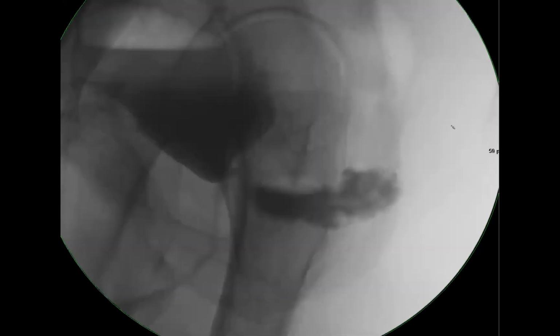I wonder if you could demonstrate it with a CT cystogram. Yeah, I think we could have done that too. It doesn't involve voiding, which might have been needed to bring it out though. Yeah, I think that's a really good thought. And with any of these cystograms, you want to maximally distend the bladder as much as the patient can tolerate. But I always like the cystograms more because you can pressurize the bladder. It's hard to pressurize a colon. Yes, definitely.